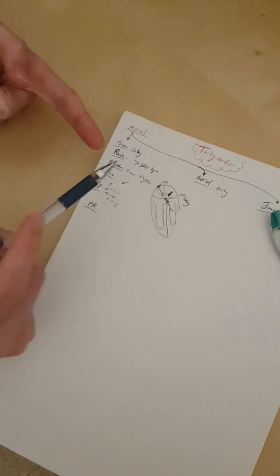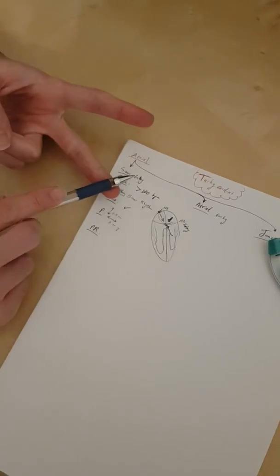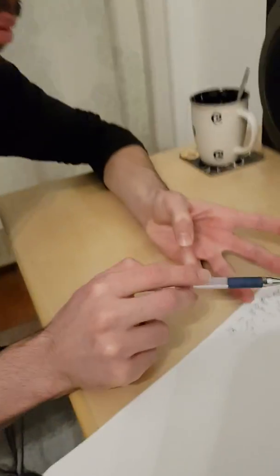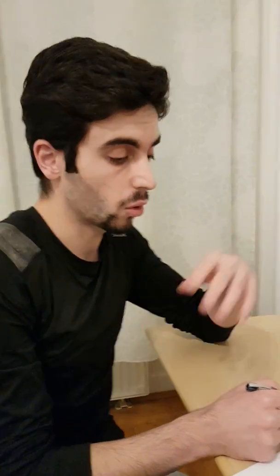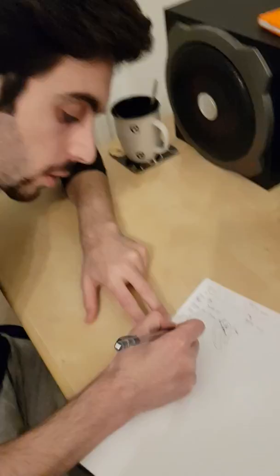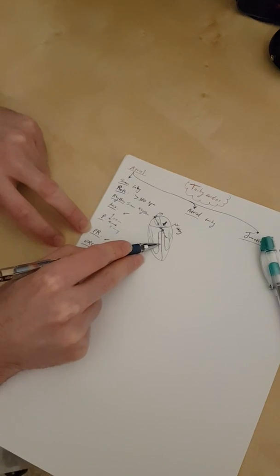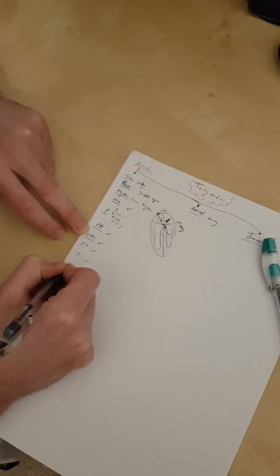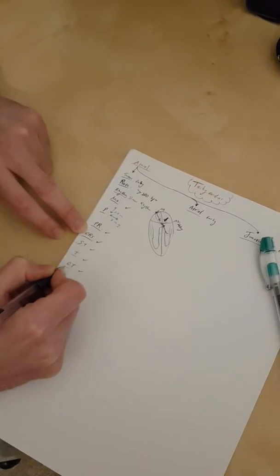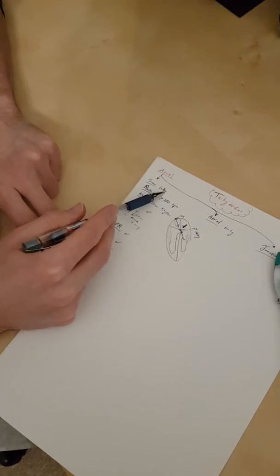This can be, for example, due to increased sympathetic tone, so more adrenaline, noradrenaline. It could be decreased parasympathetic. It could be due to ischemia, fibrosis, inflammation, whatever. You can name a lot of reasons. Anything that can happen on the SA node can cause a tachy or a brady. So PR is what? Fine. QRS, since it's being conducted through the normal pathway, that's why it's going to be also fine. ST, fine. T, fine. QT, fine. All fine. Of course, QT, we need to correct it because we correct QT when there's a tachycardia or a bradycardia.